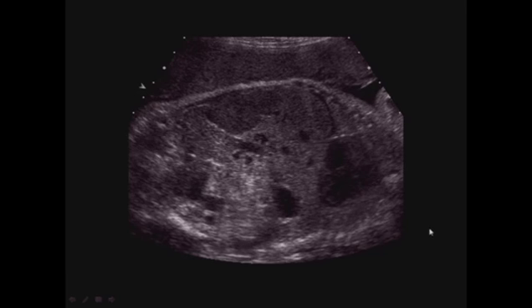Here's another coronal image in a different patient. 100% credit goes to my sonographer who identified that there was a lesion in the liver, and I think it's pretty darn hard to see. Taking pictures of the liver is not part of our protocol, but she identified it on this coronal image, and again for some anatomy, this is the heart, this is the diaphragm, this is the stomach here, and the liver is here.